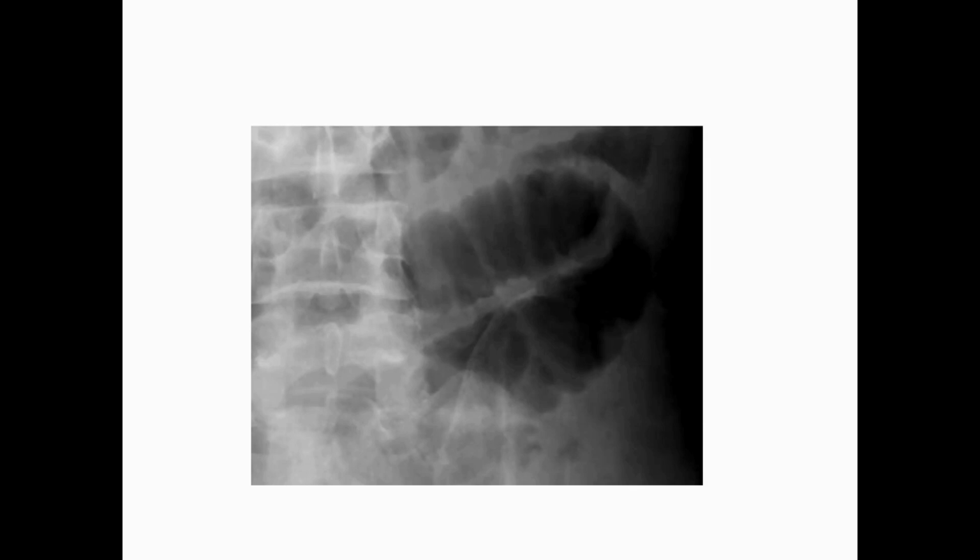If you look here, it's a localized dilatation of the small bowel. This patient had pancreatitis and presented with abdominal pain. When he had an X-ray, it showed only this localized dilatation of the small bowel.